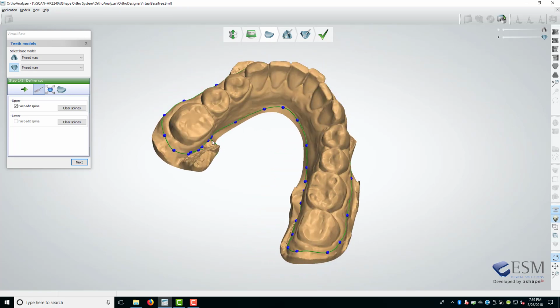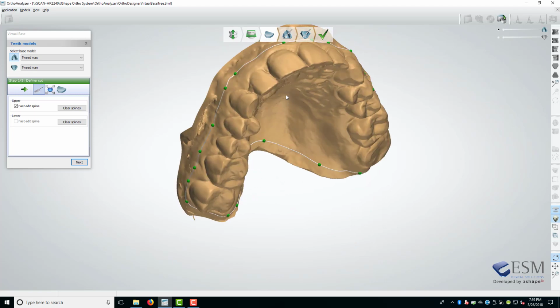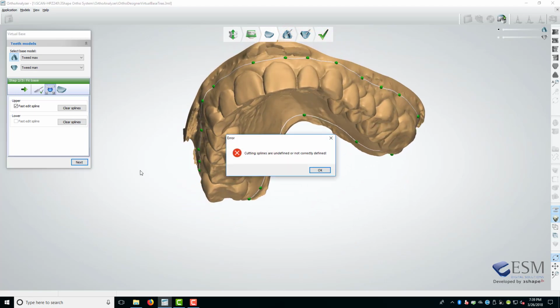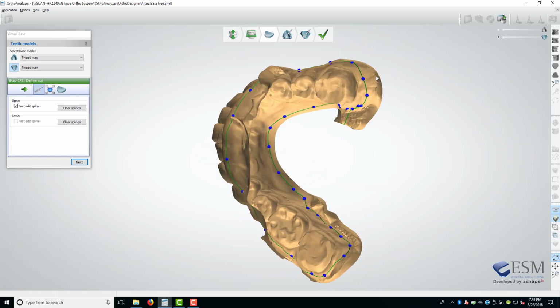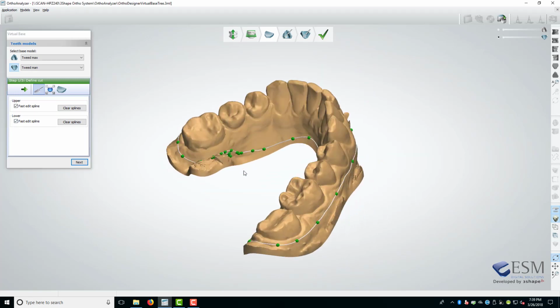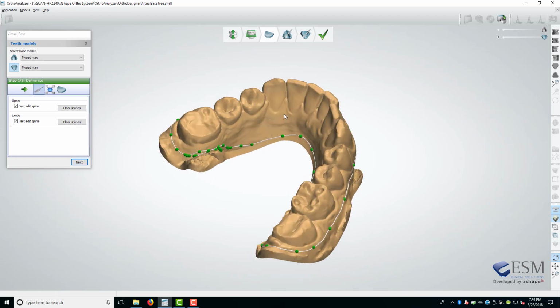Something's really screwing up here. What the hell? That's the upper. Next. You want to go into the lower. Yeah, I'm going to be messing around with this. Yes, did it. Oh, that's just a mess. What the hell happened there? All right, I'm starting over.